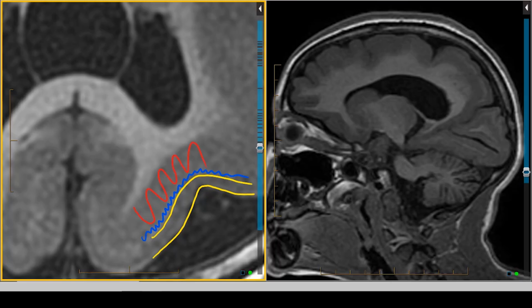So we can see there's all the features of Lissencephaly with band-type heterotopia seen here. We see the featureless surface, we see the cell-sparse zone, we see the band-type heterotopia subjacent to this. As mentioned, in this individual we do not see this anteriorly. This was not seen anteriorly here. There's relative sparing. That posterior predominant involvement of Lissencephaly with band-type heterotopia is often associated with abnormalities in the LIS1 gene.